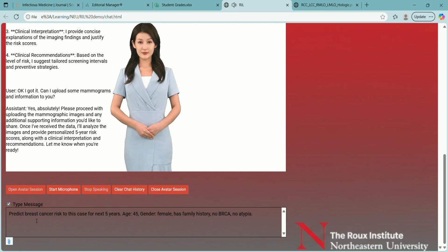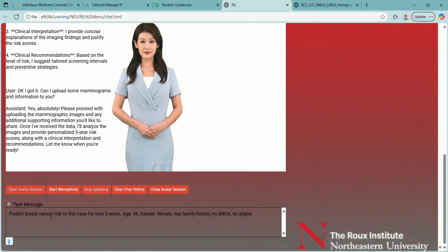Okay, I typed the information of this case beforehand, and I'm gonna feed them into the agent along with the mammogram I showed you previously. So I'm gonna open it up here and upload the image, but it won't show in this screen because the app doesn't capture the process for uploading the image. Okay, image upload is done, and then I will click enter and see what happens.